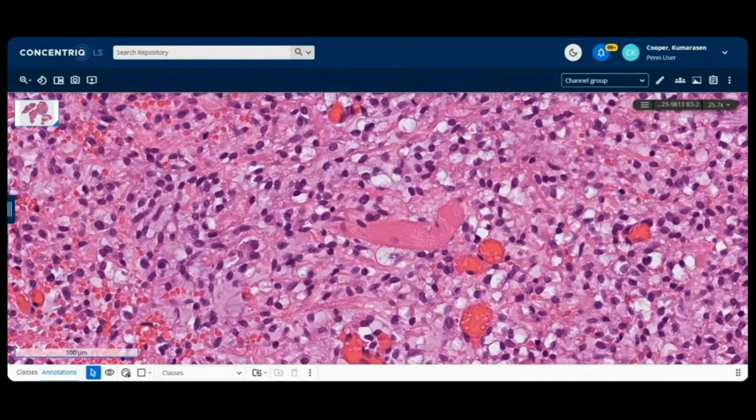So it's hard to predict. I mean, this we'd call neoplasm or tumor, right? NTRK rearranged neoplasm or tumor. I don't think anybody would call this sarcoma right off the bat. Some people may say low-grade sarcoma, a little more cellular, but the morphology would put it into a particular grade.